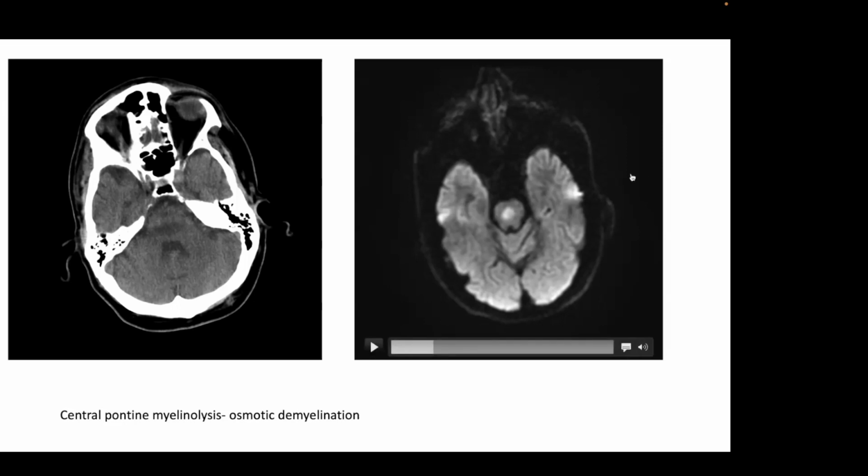But I want you to appreciate the difference between this lesion, the lesion I showed you in the previous case, that kind of blotchy lesion that was ischemic, and the unilateral pontine perforator that I think is the most typical appearance.